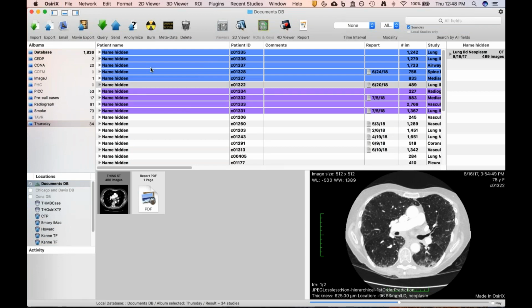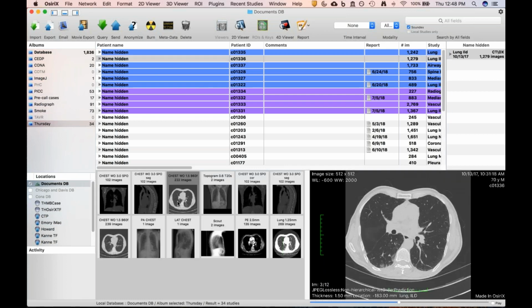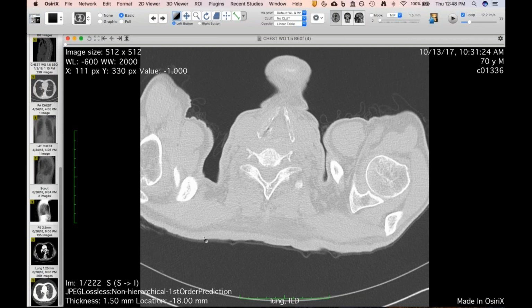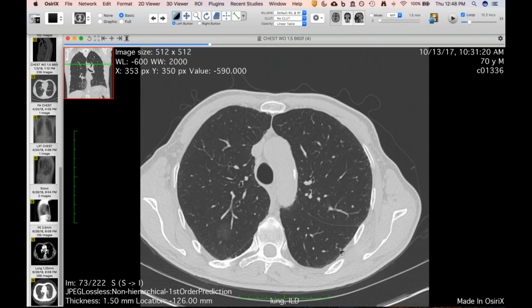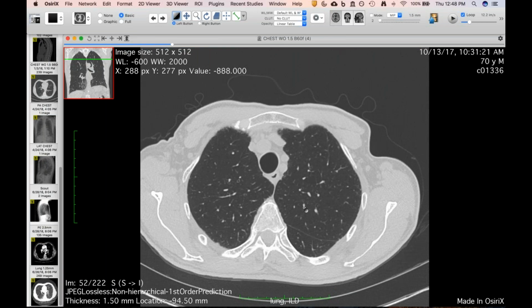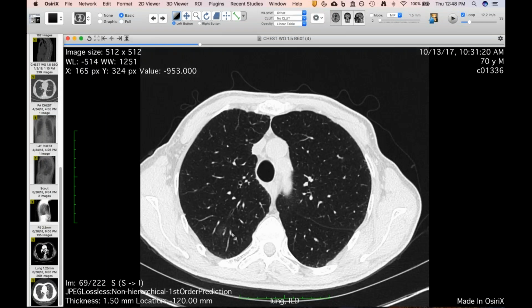And then this one, which I just saw yesterday, is even, I think, a pretty interesting example. So this is somebody who was also diagnosed based on this CT. They had shortness of breath. And here you can see they do have a little bit of reticular abnormality, 70-year-old. He's got some faint little ground glass opacities here.